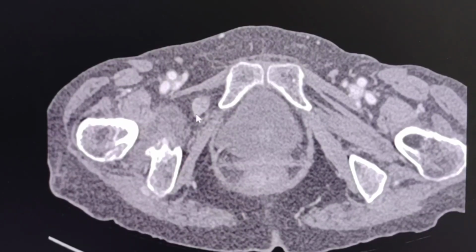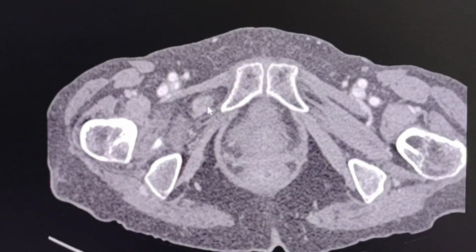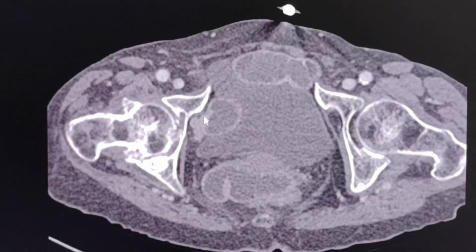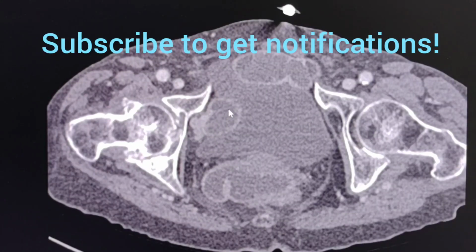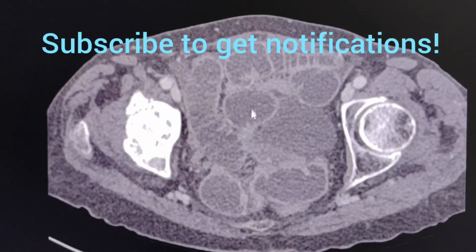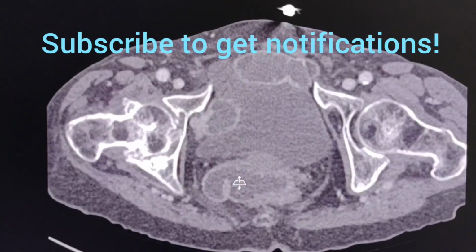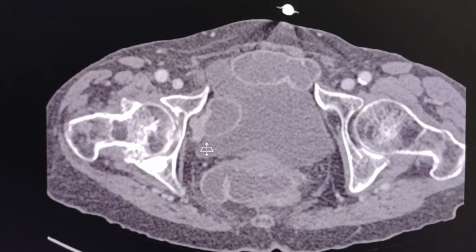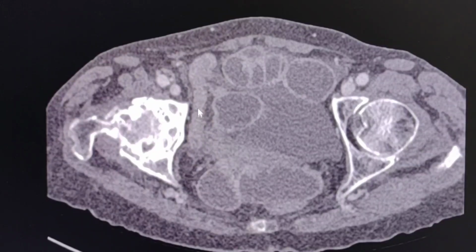This is called obturator hernia. This is a right obturator hernia containing a small bowel loop which is collapsed. If we go a little further up, we can see that there is a stenotic point here and upstream dilatation of the small bowel. The terminal ileum is collapsed.